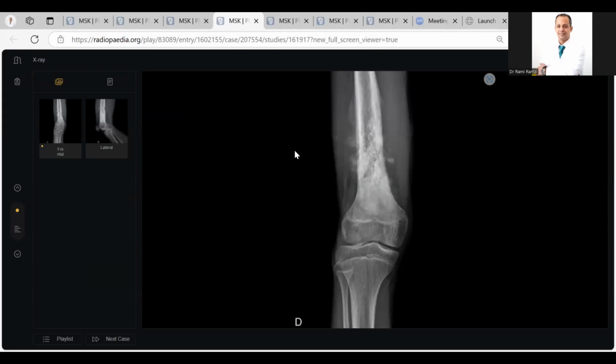Please, please, please. This is osteosarcoma. I didn't hear it till now from all the candidates. This is a sclerotic lesion, ill-defined, with a wide zone of transition. I wanted to hear this buzzword. And in addition, there is not only Codman, there is also a sunburst appearance, like here, some laminated periosteal reaction. All of this is aggressive.